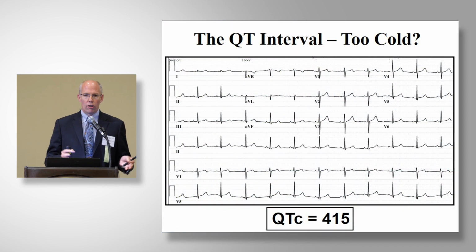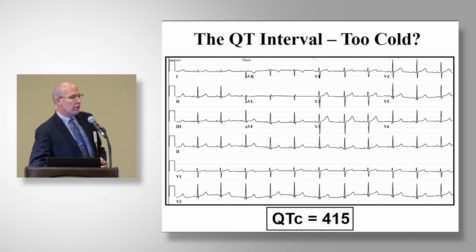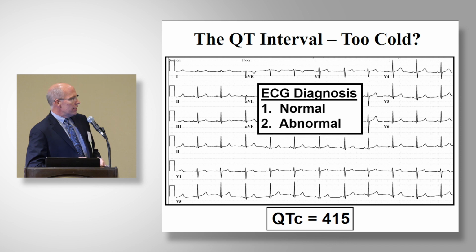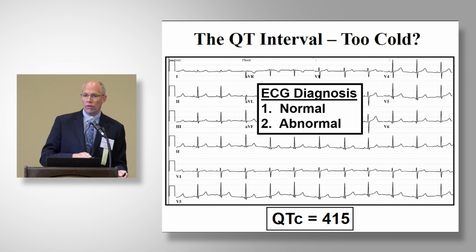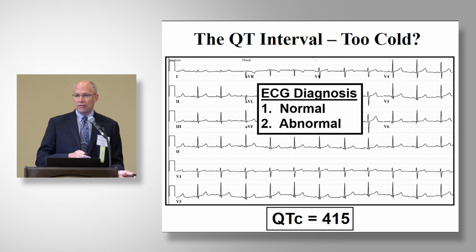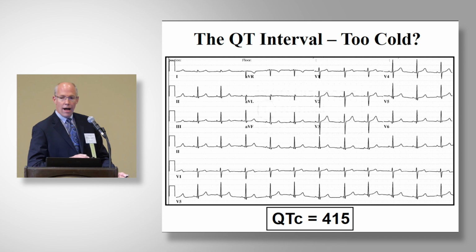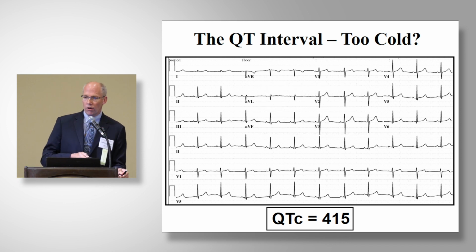And then we have, on the flip side, this issue. So that one was really long. Now look at this electrocardiogram. If you agree with what the computer said, then I need you to tell me, is this ECG diagnosis normal or abnormal? It's easy, isn't it? After that great salad that we had, this is as normal an ECG as it gets. Unfortunately, this completely normal ECG happens to belong to somebody who absolutely has long QT syndrome.